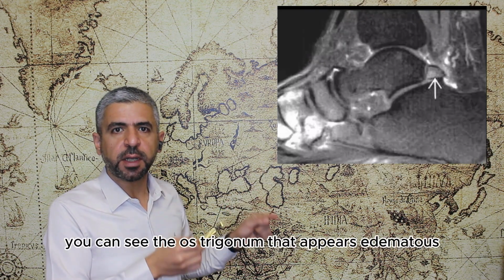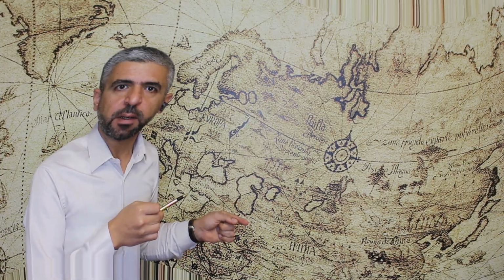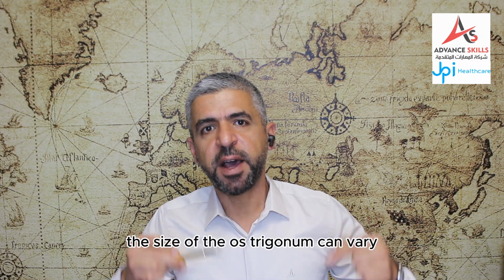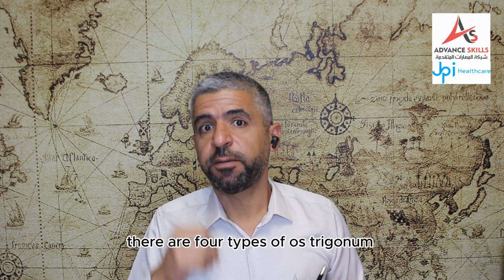Another example here, you can see the os trigonum that appears edematous with some surrounding edema. Even intra-articular loose bodies can be seen. The size of the os trigonum can vary from absence of the os trigonum to grossly enlarged. There are 4 types of os trigonum.